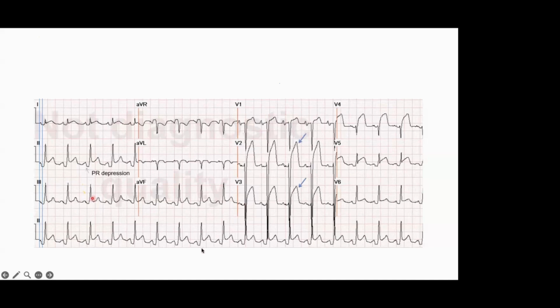V2 to V4 convex. That's one. Okay. And the important 2 things: poor R wave progression. Yeah, loss of R wave height, QRS height. Then you can see how this is going up. This ST being pulled, this S wave is being lost, because this T is going up. This is pulled up like this. Dome like ST elevation, loss of R wave. So this is 100% STEMI.